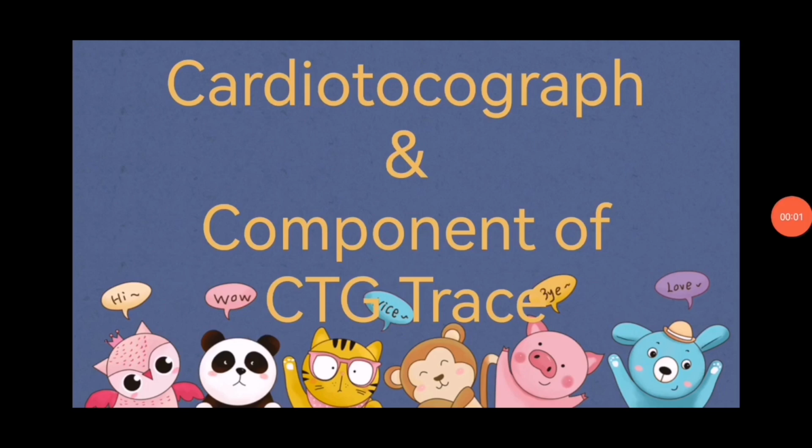Hello friends, today I am going to discuss with you another important topic, cardiotocograph and component of CTG trace. In exam, questions come in the form of a scenario and a trace. If you know the component of the trace, you can easily answer the question. In this video, I am only focusing on cardiotocograph and the component of the trace. The interpretation, I will discuss in another video.